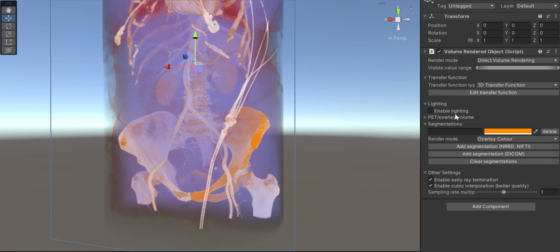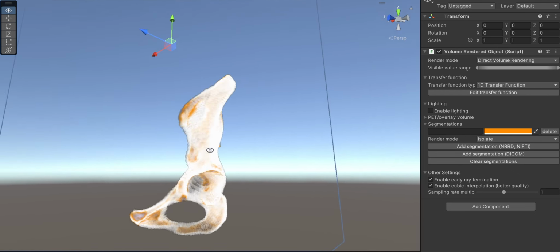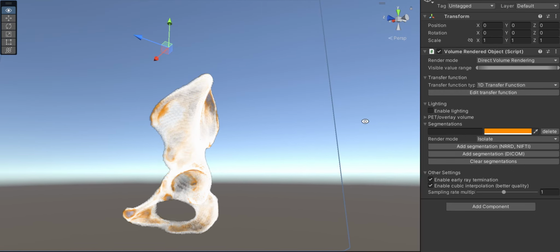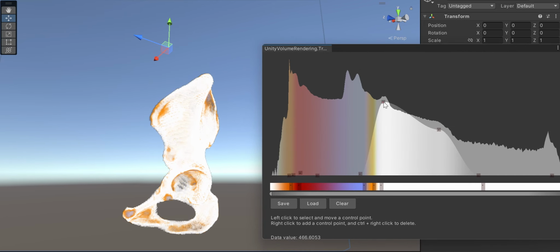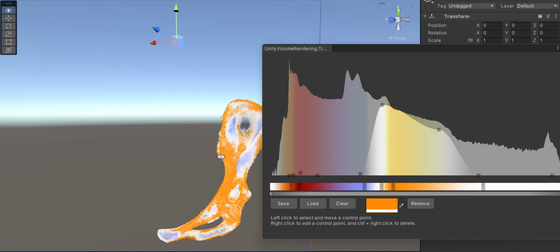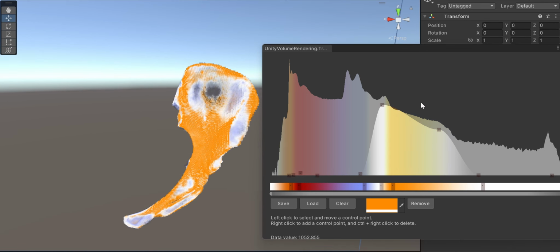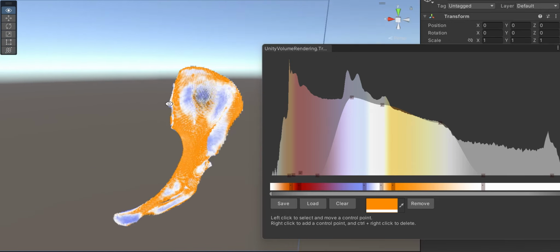And like in the last video, we can also set that from being an overlay color to isolate, and then it will isolate out that particular structure. And if we go full on the alpha here, we can tweak that so it looks better within that restricted isolation. Taking these alpha values up usually makes it look a lot better, and you can change the colors, etc.